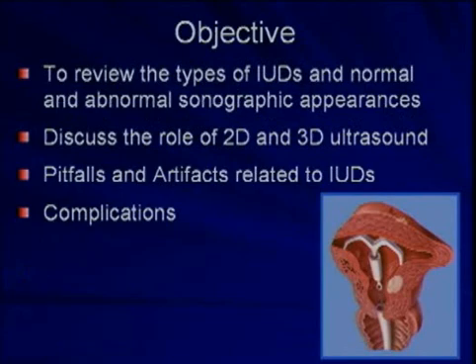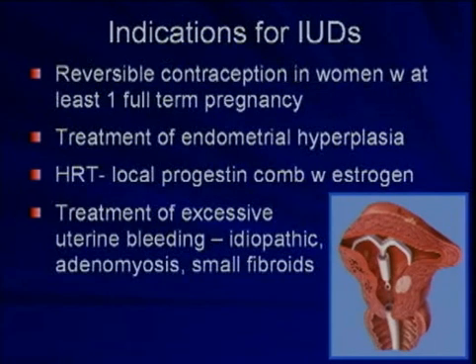The objective of this presentation is to review the types of IUDs and normal and abnormal sonographic appearances, to discuss the role of 2D and 3D ultrasound, and review the pitfalls and artifacts related to IUDs, as well as the complications.